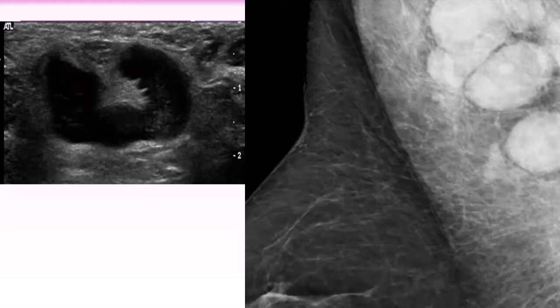What about the adjacent tissue? It looks normal, with only the lower one showing surrounding perinodal edema. Yes, perinodal edema. So definitely these are pathological lymph nodes and even suspicious on mammography. Suspicious lymph nodes.